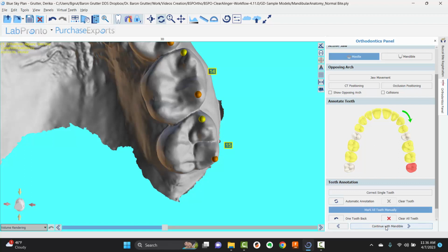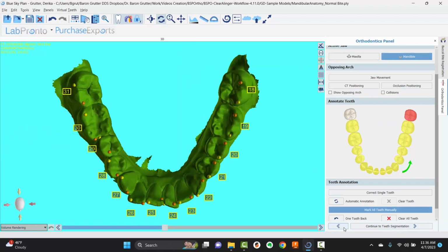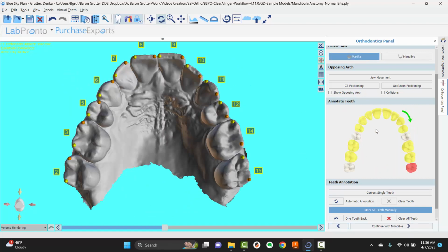All right, we can go ahead and click to mandible. Oh, notice one thing. Let me go back for a second. It skipped two teeth. It automatically knows to skip if it notices the tooth is missing. Whether it gets the correct premolars doesn't really matter, honestly. Whether it's first or second, they have the same movement limits. But just so you know, it will skip for you.